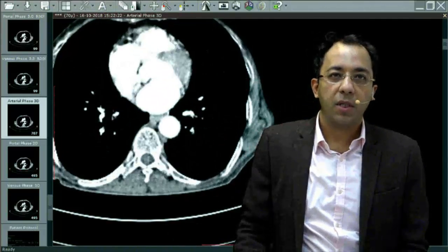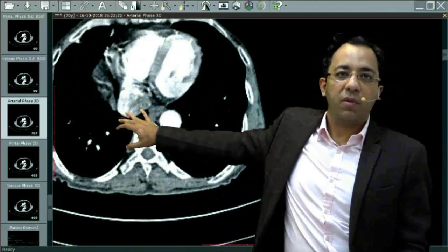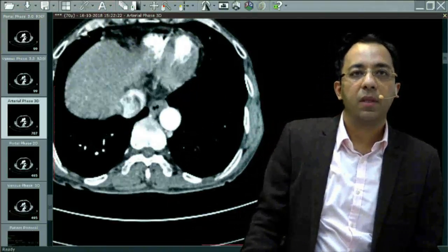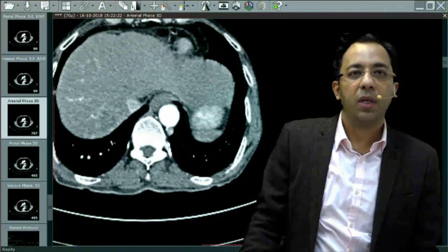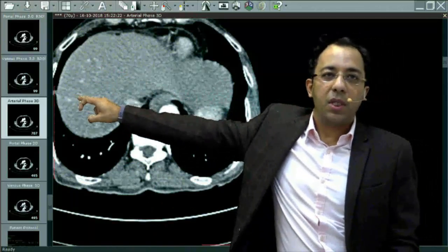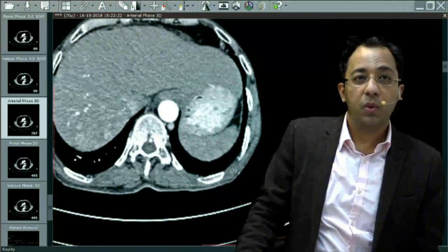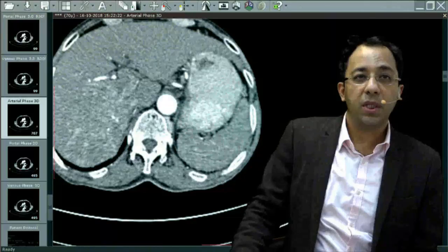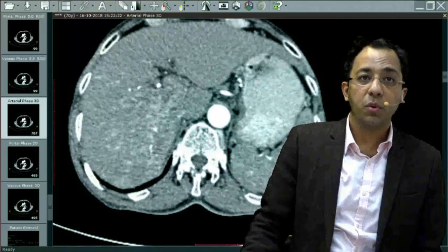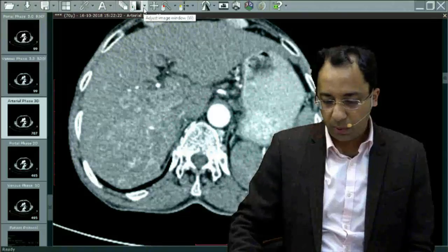So keep looking at the right atrium that I marked for you. We are going down. You can see this is the area of the inferior vena cava. We feel there might be some expansion here. It looks a bit expanded, and then in the same area in the liver where we saw the hypodense area, you see some enhancement. And when we go down towards that area in the right lobe where we saw, if you remember, that area looks diffusely abnormal. You can do a little bit of windowing to make it more visible for you.